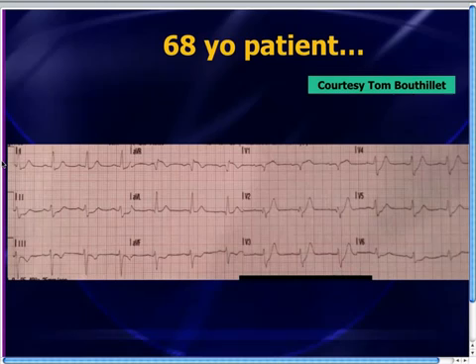And what you notice on this 12-lead EKG is that there's a bunch of leads that have a little bit of ST segment depression, flipped T waves, and in all of those precordial leads there's ST segment depression. Let's just go right to those precordial leads, in fact, and focus on them. What you notice is something a little bit unusual, and that's what we're going to talk about.